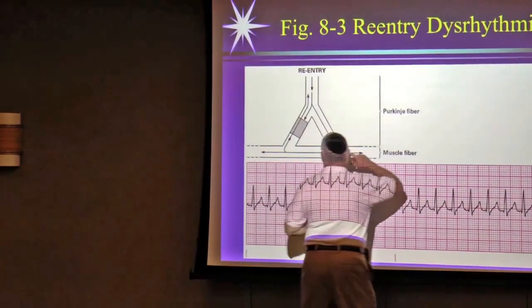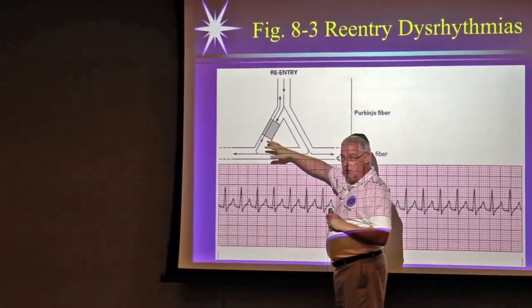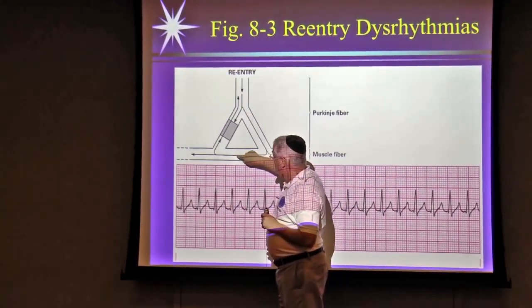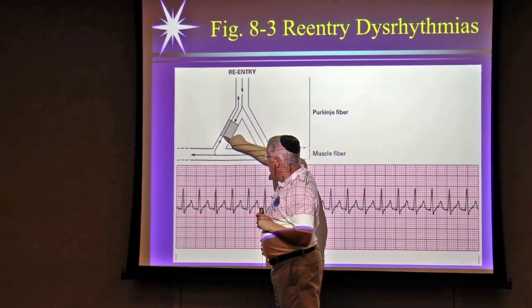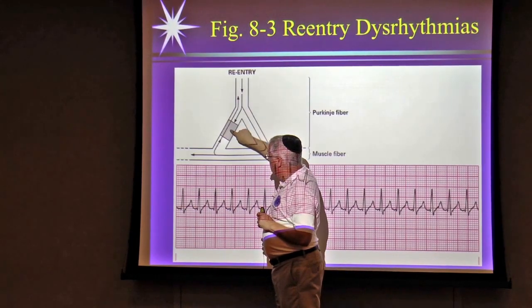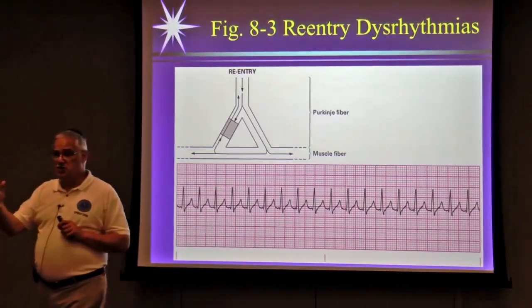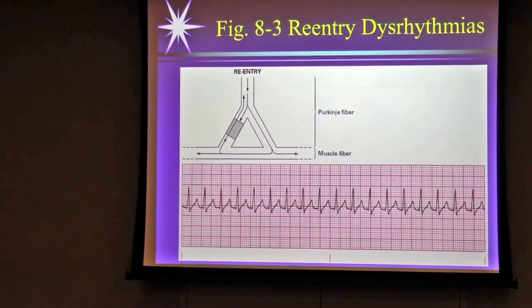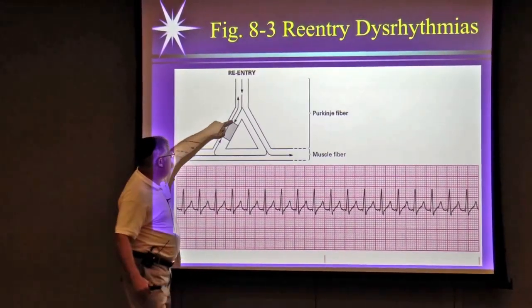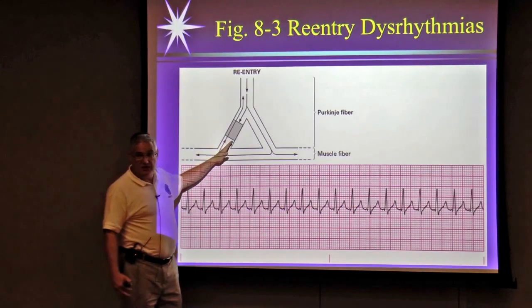So what should really happen is that both impulses should come down here and go on their merry way and continue depolarizing heart muscle, right? Here, it comes down, goes like it should, but as it comes back around, it hits here, and for some reason it can go through the block, okay? This area, if it had been depolarized, would be used up, right? In other words, once an impulse, electricity, travels through tissue, that tissue is used. It has to rest again before it can contract, right? That's the repolarization. But what happened here is that since that impulse stopped here, this never got depolarized. As it travels back up, it's fresh, so it allows it to depolarize.